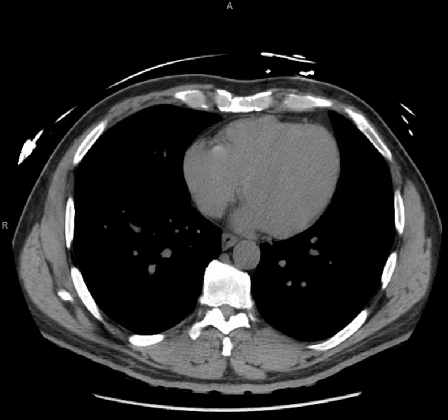Here, what you see is them starting up high. By tradition, when you look at cross-sectional imaging, this is a cross-section of the patient, assuming the patient's lying supine on the bed, and what you can see here is the actual bed, right? And there's the cushion and stuff. This is the bed, and the patient's lying on their back, presented to you with their stomach up. Okay, and the classic orientation is head away and feet towards you. So this becomes the left side, this becomes the right side.